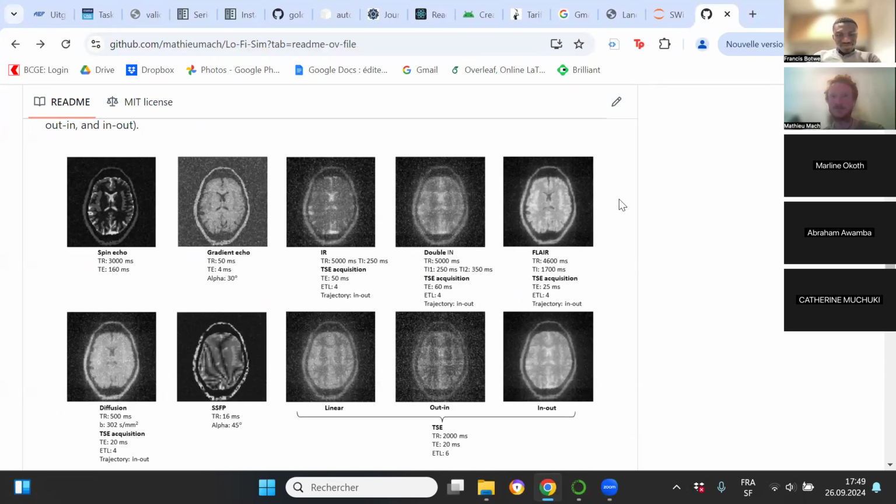So I always say the best way to learn is to keep practicing. Just do it. And once you have this, not like the scanner, you can take it anywhere and just practice it and see how it works. And the good thing is the information is also there, like the sequences. When you highlight on it, you can just click and it will lead you to where the sequence and the concept and everything is, and you'll be able to read and understand it well. So yeah, I think that's awesome. That's good.